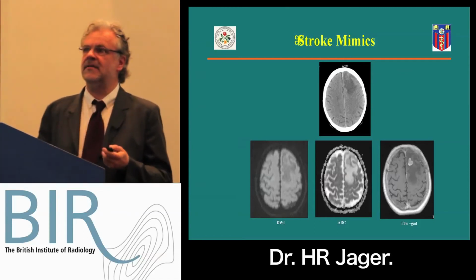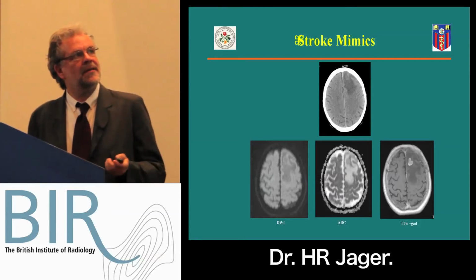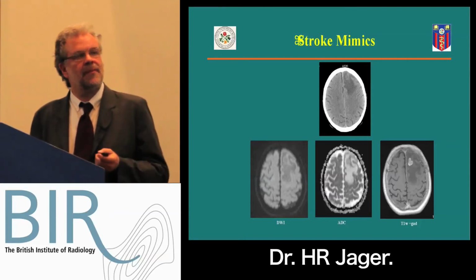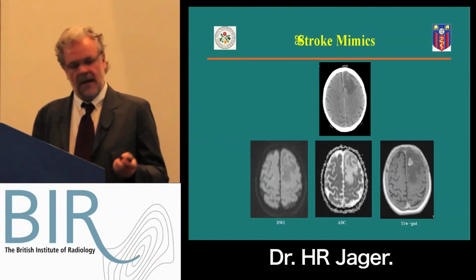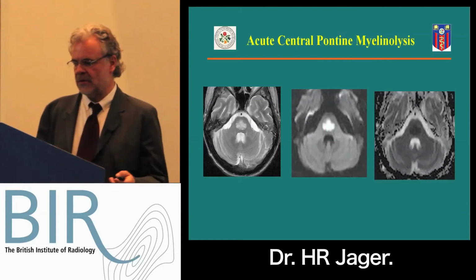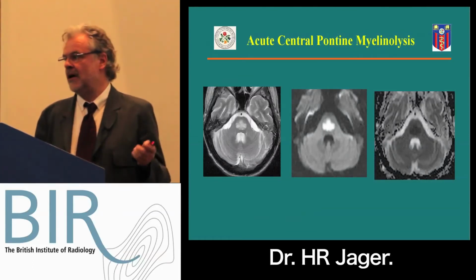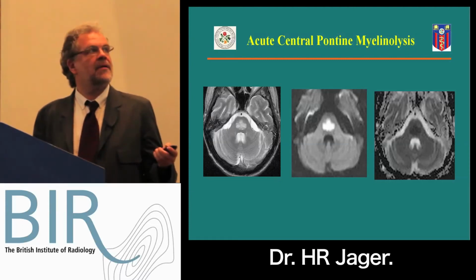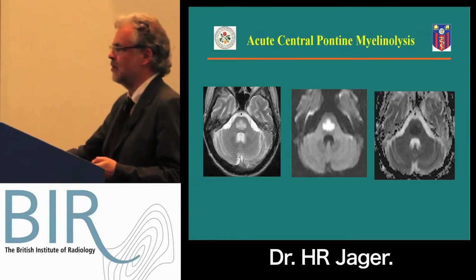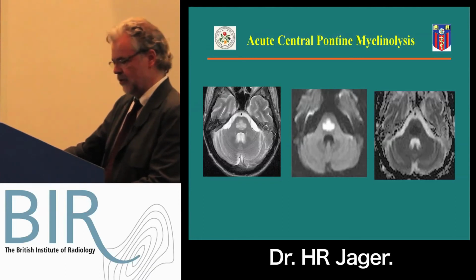That's a recent case from 2 weeks ago. Somebody's nodding up there. It's an HIV positive patient presenting with brainstem syndromes, and there was some sodium imbalance. And if you look at this, you can have acute central pontine myelinolysis with a typical trident shape. You have to be aware of. Normally you see it chronically down the line, but in the first 1 or 2 weeks, this can actually be bright. And so acute myelinolysis due to cellular swelling can restrict the diffusion.